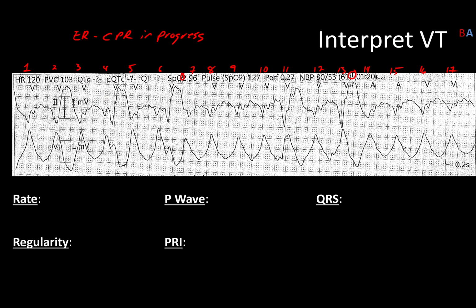We have longer than 6 seconds, so 13 times 10 equals 130, not crazy fast. We're definitely irregular. Not terribly, but enough that it would be a little too challenging to pin down exactly how fast the rhythm's going.